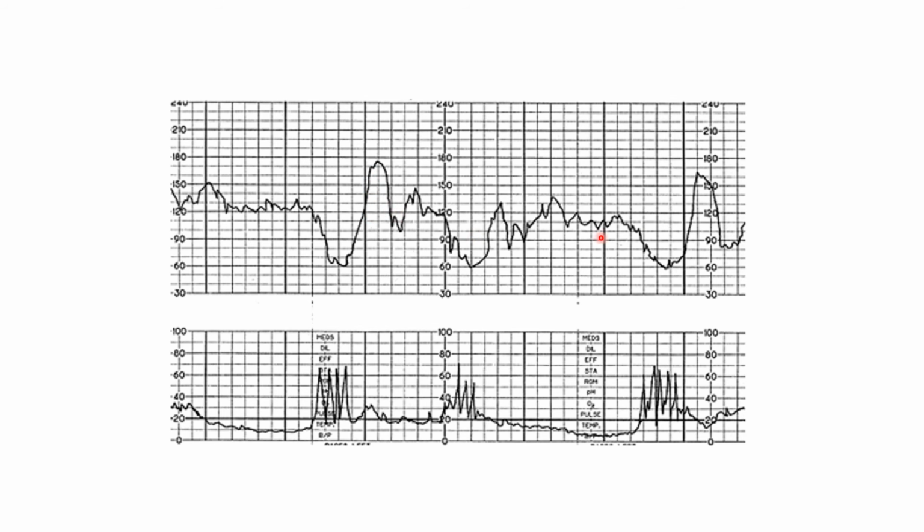except perhaps this, and you can call this shouldering because it is right at the end of the deceleration, so you can't call it an acceleration, but you can call it a shouldering. And this is a deceleration, and this deceleration is late, and this deceleration is also late, and this deceleration is also late. So they are variable and late decelerations.